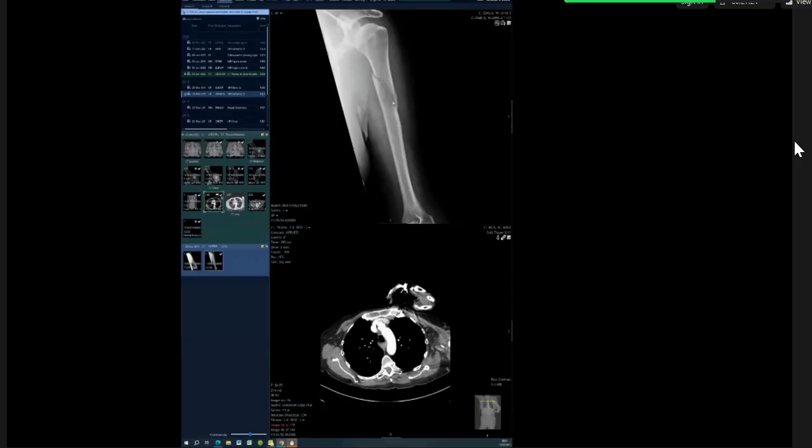So describe the fracture. Always say displacement, not displacement, stable, unstable, if that applies. It doesn't really apply here much, but you can say that there are cortical breaches on both sides. And you rightfully said there is a lytic lesion. Straight away you said the bone is normal, and then you said it's abnormal. Like I said, always with the fracture in a viva, there's something wrong about the fracture. It's not a simple fracture.